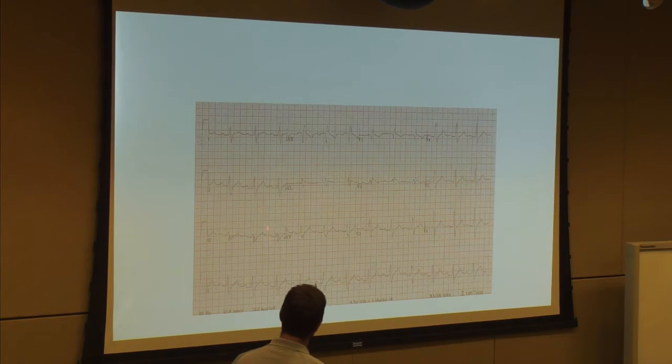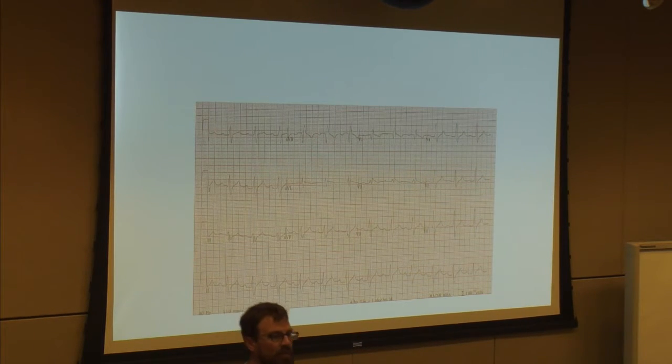You could argue that there's a fair amount of QT prolongation. You could argue that this QRS widening is due to sodium channel blockade, and I have a first degree AV block. Well, what class of drugs do I know is a potent sodium channel blocker as well as a nodal blocking agent? Blocker being the big hint in this one, right?